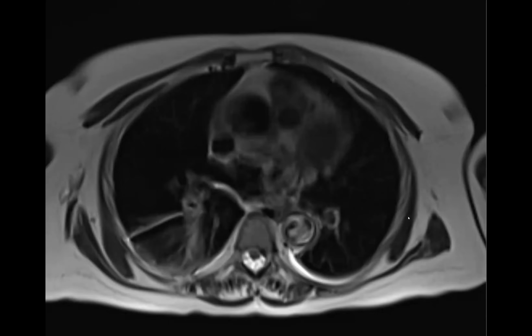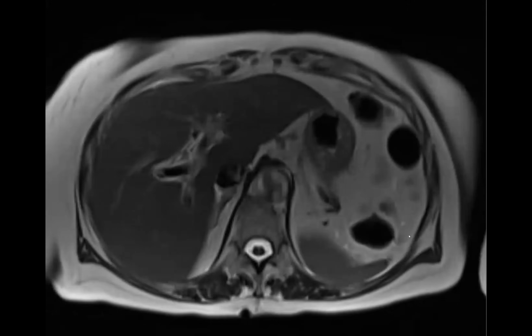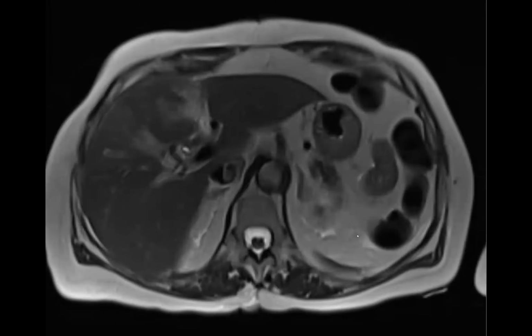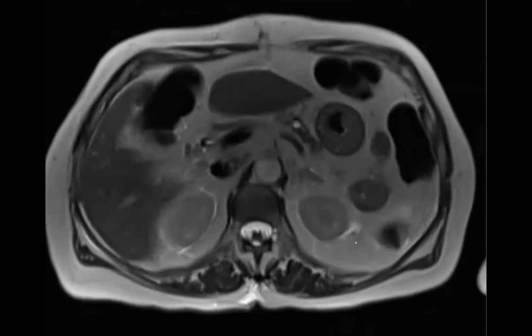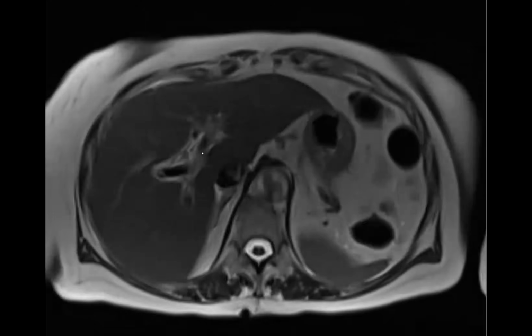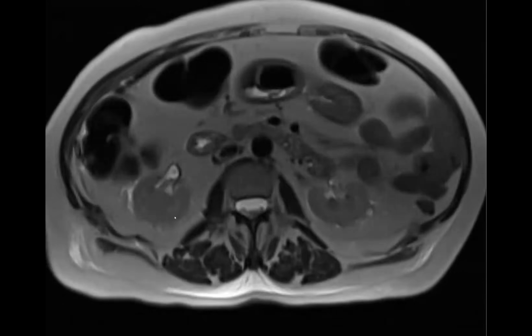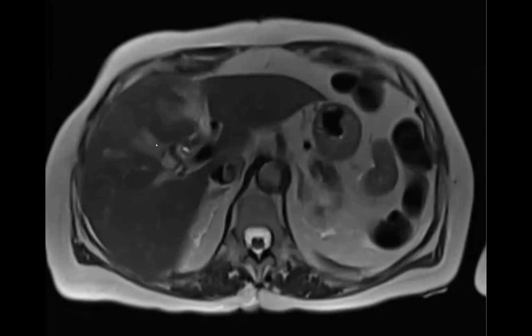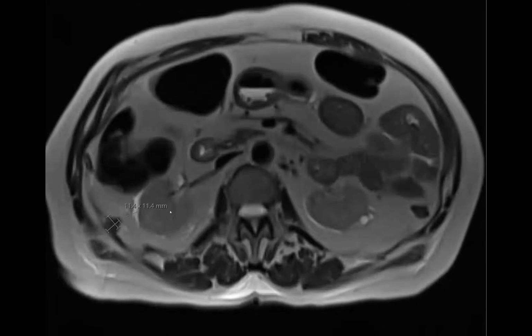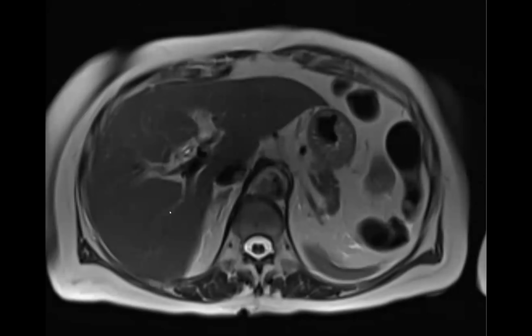This patient had a cholecystectomy and they were concerned for a CBD transection. There is a drain in place. This is what the biliary tree looks like on the T2. When I first saw this, I was like, biliary transection, you would think there would be a huge bile leak. I don't see any fluid here. But anyway, the bilirubin was only like 3. So we decided to do an Eovist.